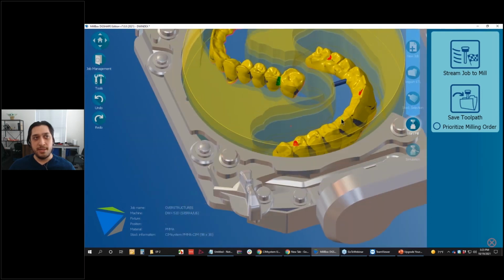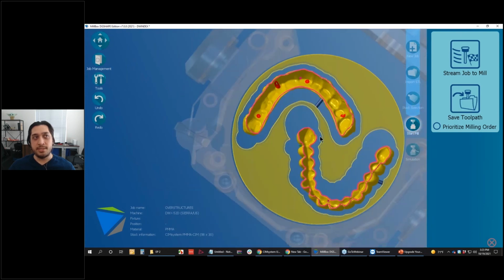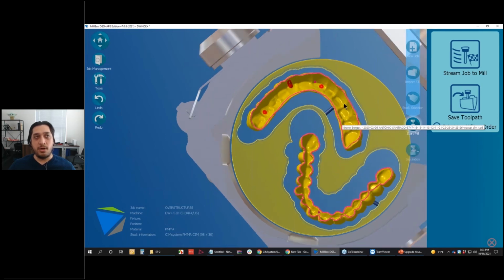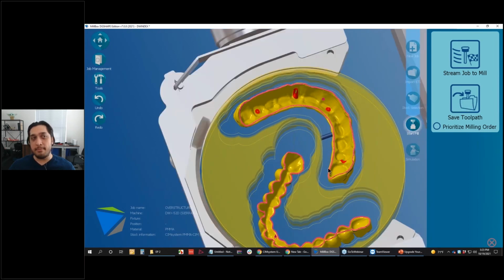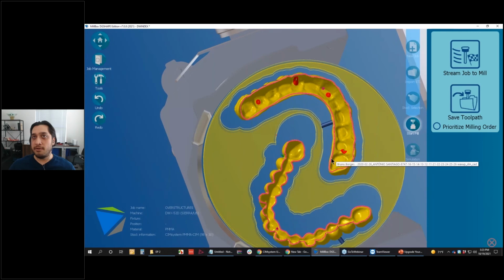in particular, these external undercuts. You want to make sure that those are all hit. The internal undercuts, 9 times out of 10, you're going to want to use your construction info or PTS. You're not going to want to always rely on the CAM to come in here and detect it, because if you're manually designating these, one, it's time consuming, but two, you introduce a margin for error. If we have that metadata straight from the CAD software, then there's no guessing. You're not leaving it up to an algorithm to determine whether or not it's the correct insertion direction.